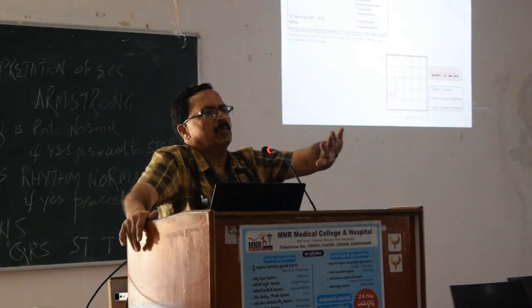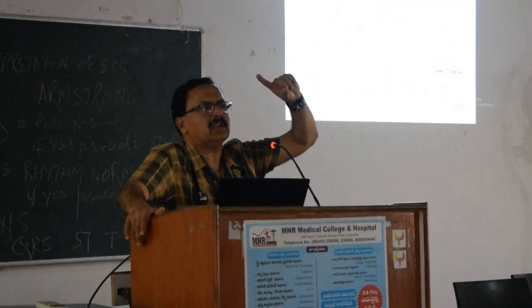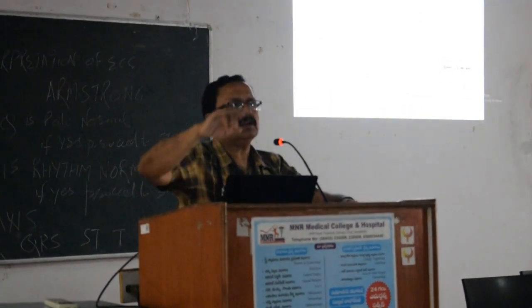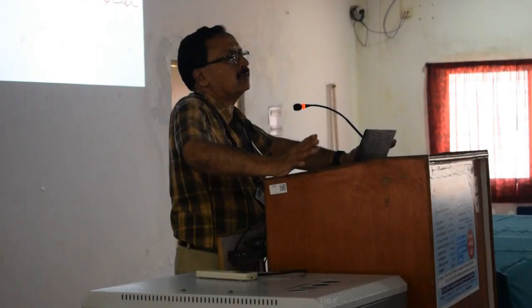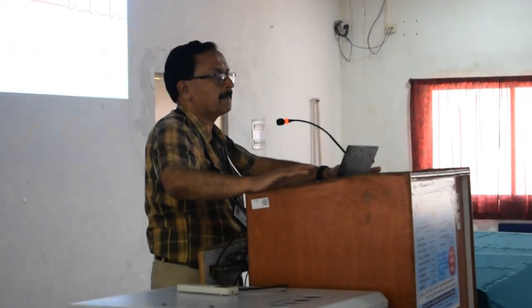So that is how one will have to handle. So coming back to the ECG paper and the cardiac monitor, my step would be that the monitor speed we should increase from 25 millimeters to 50 millimeters. But purely you will see that it is sinus.